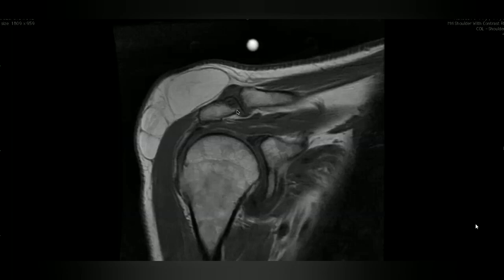You have to be careful. This is not sclerosis. So degenerative, as you have said. She is an old lady, 74. Yes, it may be degenerative, but you have to be careful, Seher. You need to listen to what I'm saying. You have to be a little bit careful in what you say and how you say things if you're going to give an exam.